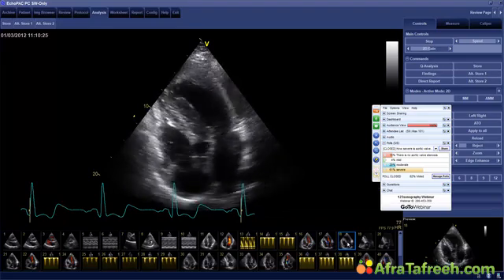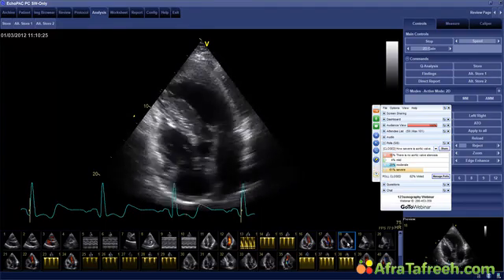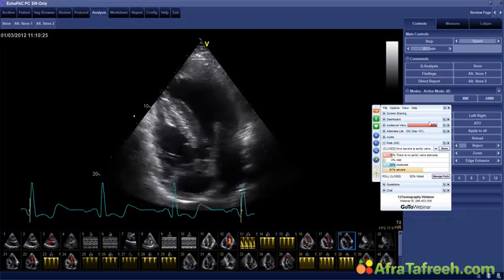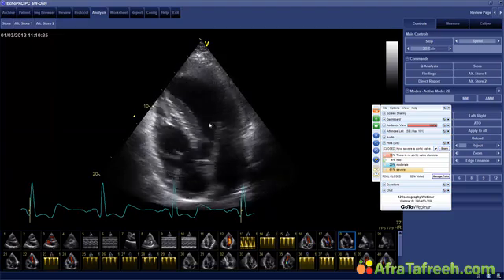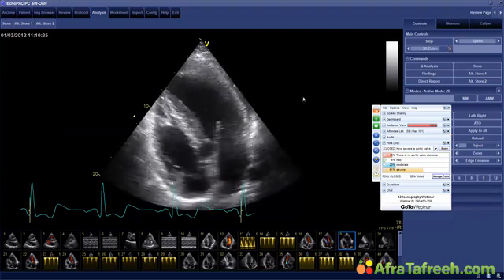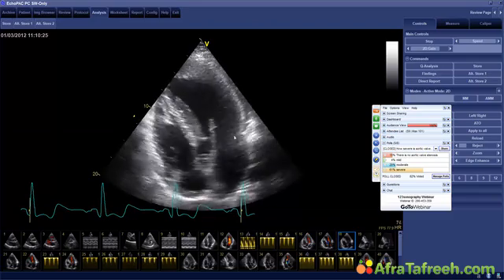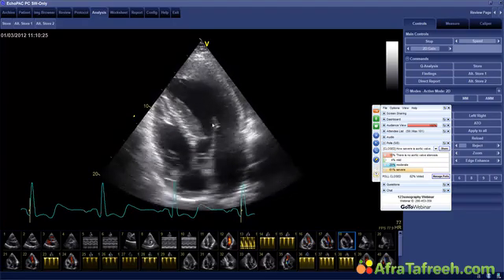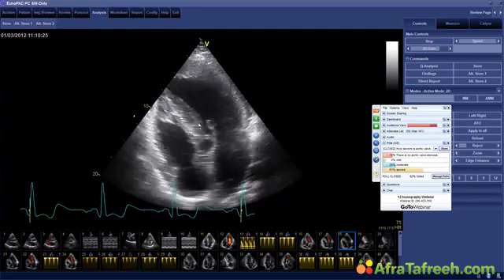Someone has asked a question. This was Niels. Niels, you have to wait a few seconds until I answer this question, because otherwise I would give away the answer, because you are completely correct. So take a look at the aortic valve, and now take a look at the mitral valve. This is a very fascinating study, something I've never seen before, because there are two things here which you should notice. Look at the motion of the anterior leaflet. You can see that the anterior leaflet touches the septum during systole. In other words, it kind of occludes the outflow tract.